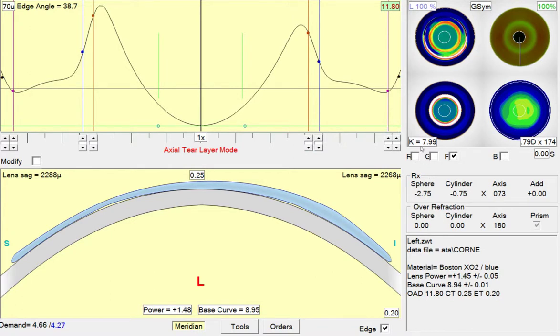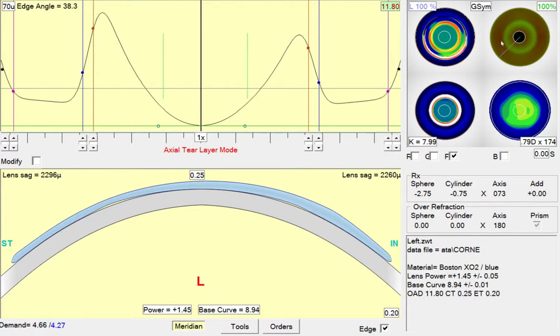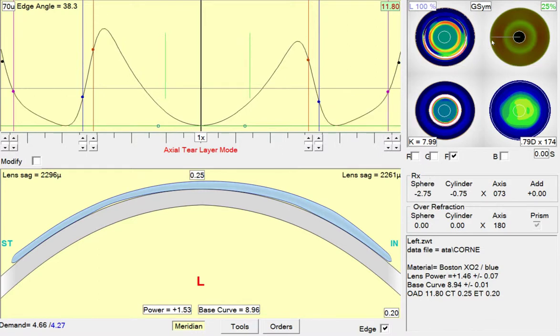So anytime you change the base curve, especially if you're in freeform mode, I recommend clicking through the different meridians in 25% mode, because you can probably get a little bit closer to target in individual meridians. Even though we did that change in 100% mode initially, it's not always uniform all the way around.